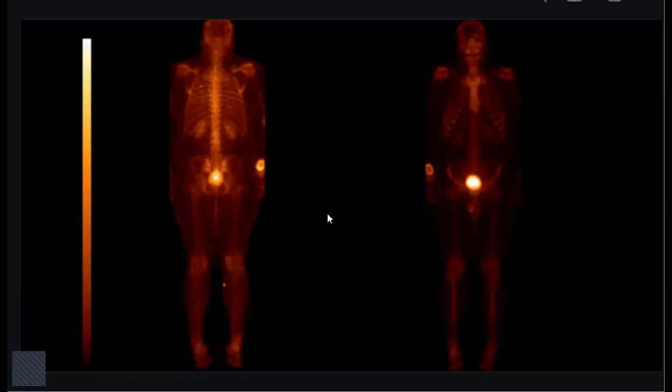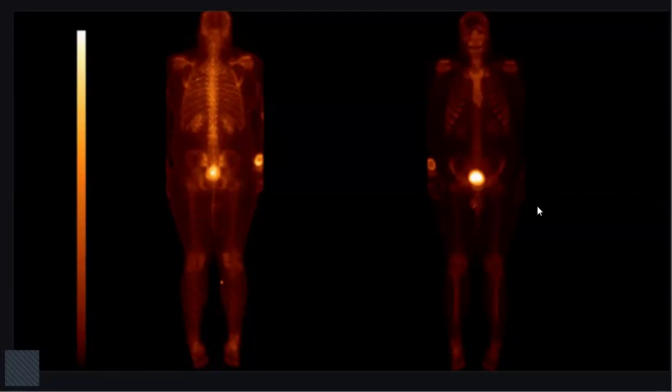What could be the possible causes? This could be due to osteomalacia. Okay, ignore the skull, nothing in the skull. There is reduced uptake seen in the femora bilaterally. The tibia also appears thin, with reduced volume.